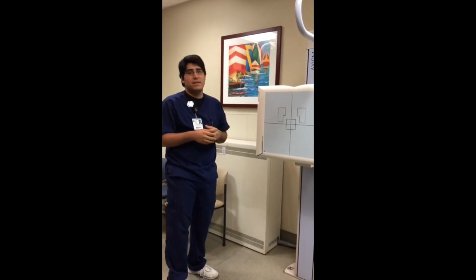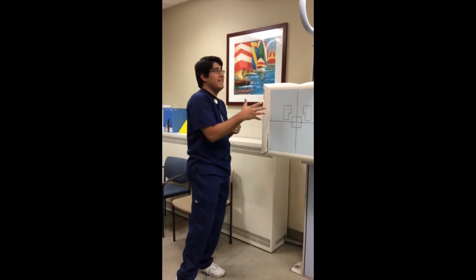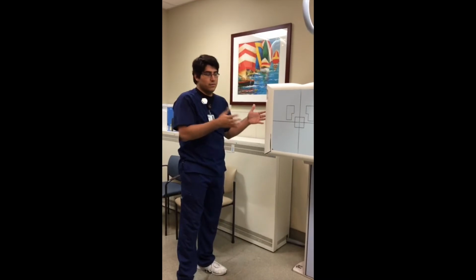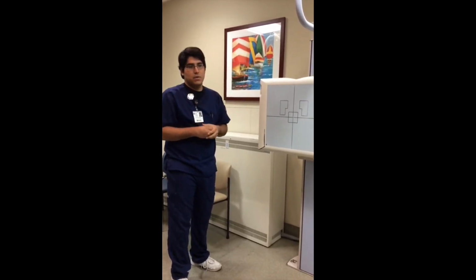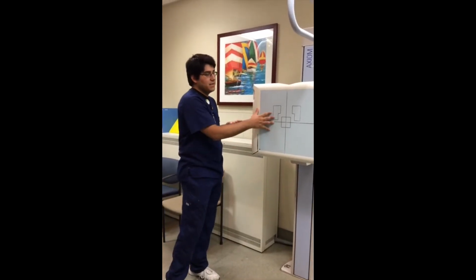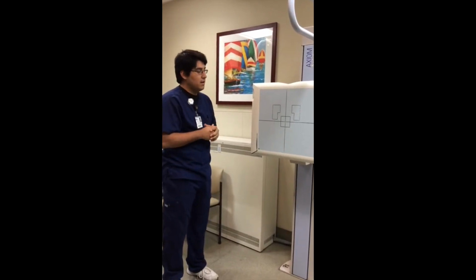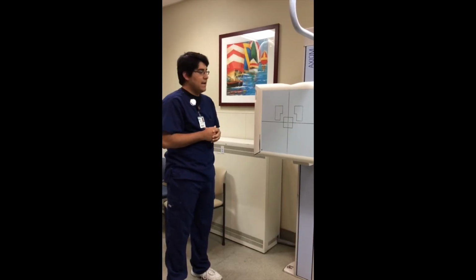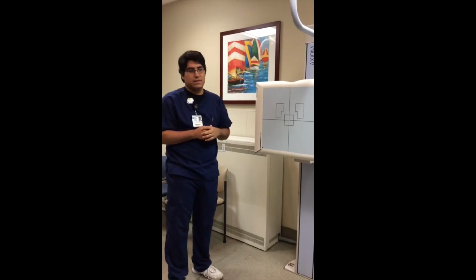So obviously if there's an extra step, there needed to be more exposure time for there to be enough conversion of light to make that current. So basically they cut out the middleman, and now it's just an ionization chamber, which once it has enough ionization or a charge of electrons, the chamber will shut off automatically. And that obviously reduces the patient dose. So we've progressed in that sense.